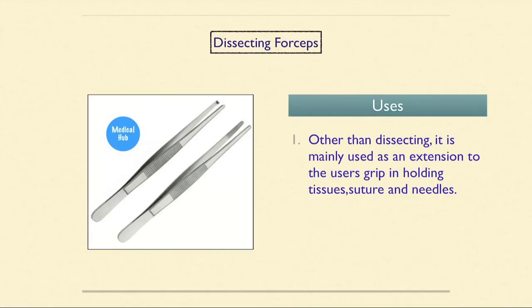Next, this is dissecting forceps. Other than dissecting, it is mainly used as an extension to the user's grip in holding tissue, sutures and needles.